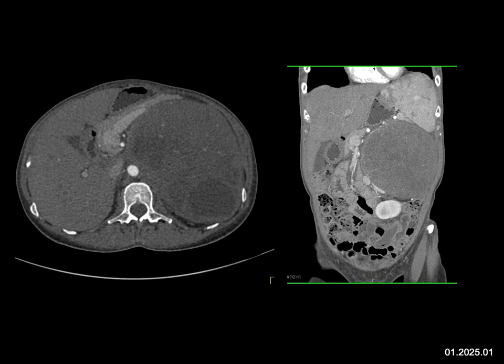Adrenal ganglioneuromas are very uncommon lesions. They're large, they're hard to diagnose, they're typically solid, though occasionally they'll be of lower CT attenuation because they're neurogenic type tumors. You see some areas of lower attenuation here, but one would have to admit the dominant mass is solid, but it's a possibility. Adrenal adenomas rarely get this large in their low attenuation, though they can, of course, bleed. But this looks too solid.